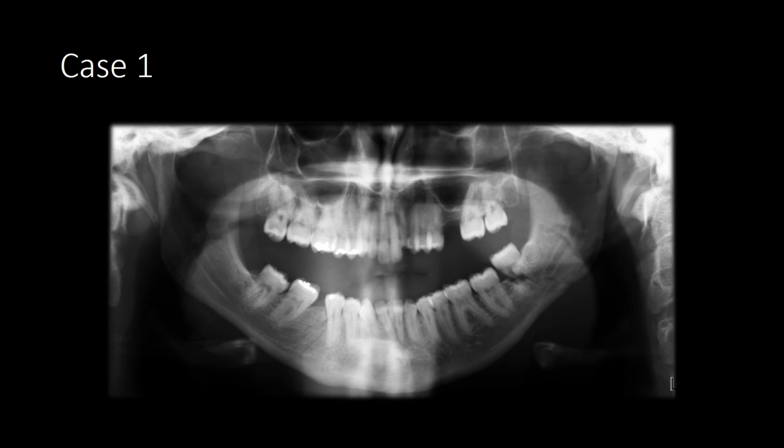And then this is when you really need to challenge yourself to find the second fracture, because again, 50% of the time, the mandible fractures in two places. So you may or may not notice that there is a non-displaced thin fracture right here, extending from the alveolar crest to the inferior border. It's kind of right at the junction of the body and the parasymphysis. But you could imagine how that fracture could easily be missed, but it has to be treated.